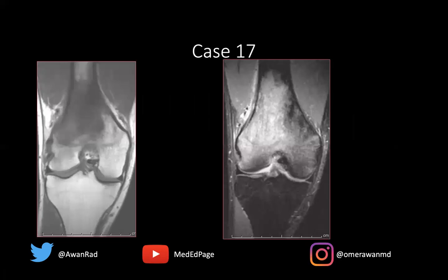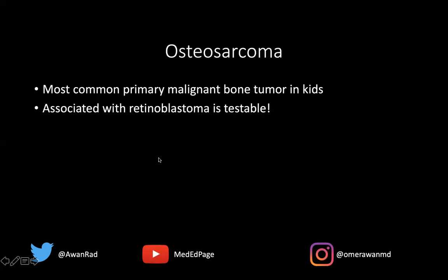In contrast to this case, which is an osteosarcoma, right? The most common osseous malignant tumor in a kid. You have replacement of the marrow. The marrow is typically nice and fatty and bright, like it is here in the tibia, but in the femur, you have dark signal, a lot of marrow edema, subperiosteal edema, lifting of the periosteum. Nice example of what osteosarcoma would look like.